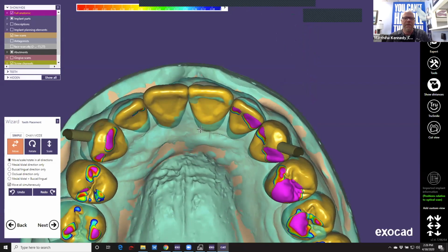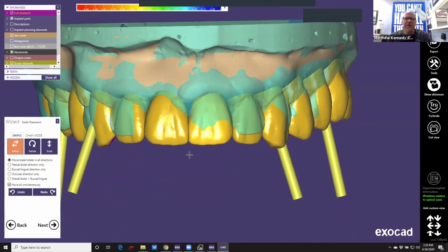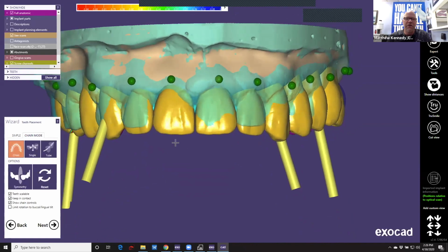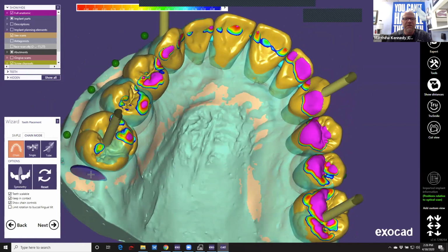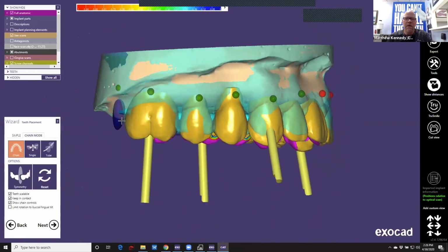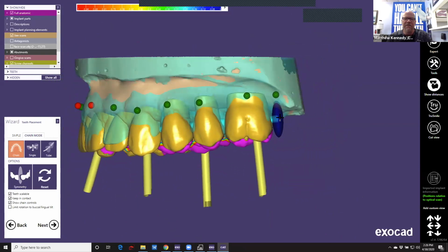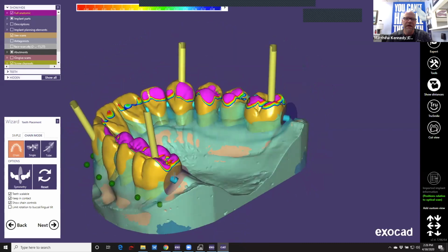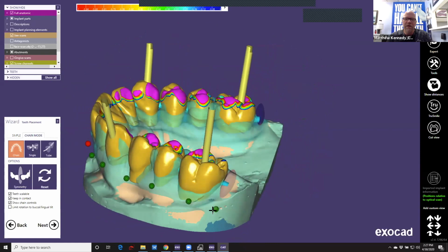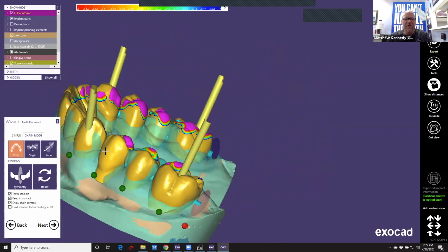Very good. Get a basic tooth arrangement. Once I get that basic tooth arrangement, I'll uncheck the simultaneously, go into chain mode. I'll lock in my two front teeth, and it's not even Christmas. We'll go ahead and drag this where we want. And again, don't forget, you have the face scan image that can help. You get teeth where you want, lock them in place. That's a great feature to have so other teeth don't move.